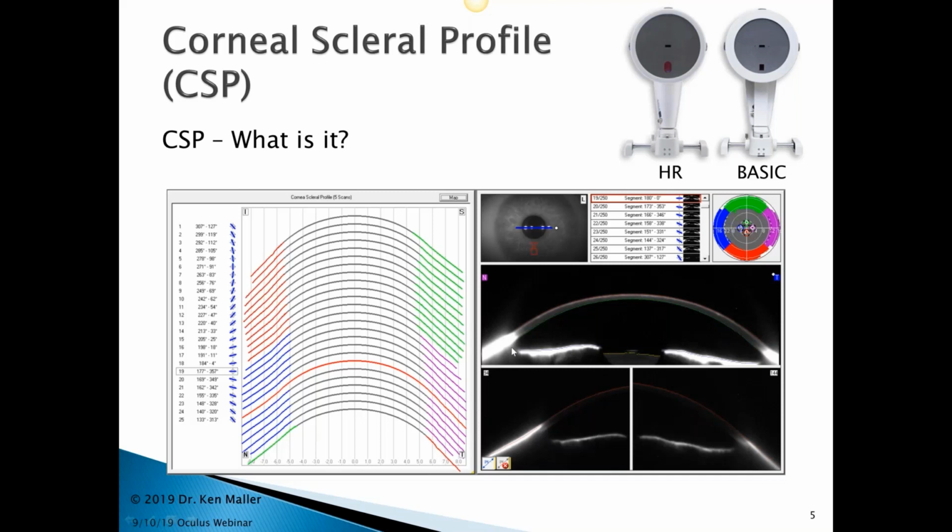And so what the Pentacam has to do when it's capturing the scleral structures, you can see down here in the lower portion, is attenuate the imaging so it's not washed out, and it can then detect the edge so it can figure out exactly where in space the profile of the sclera is. Here are the 2 extremes of the same picture that's up over here on the top.